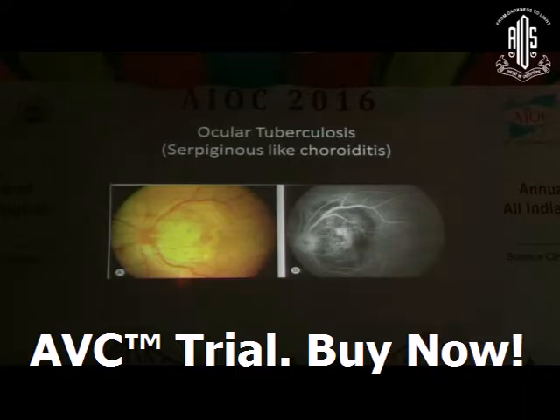Ocular tuberculosis is a very common form of extrapulmonary tuberculosis. It can present as serpiginous choroiditis or choroidal tubercles. There can be hematogenous spread or direct spread or hypersensitivity to the tubercle bacilli. There is a lesion here in the posterior pole. The central part of the lesion is healed, whereas the peripheral part is active.